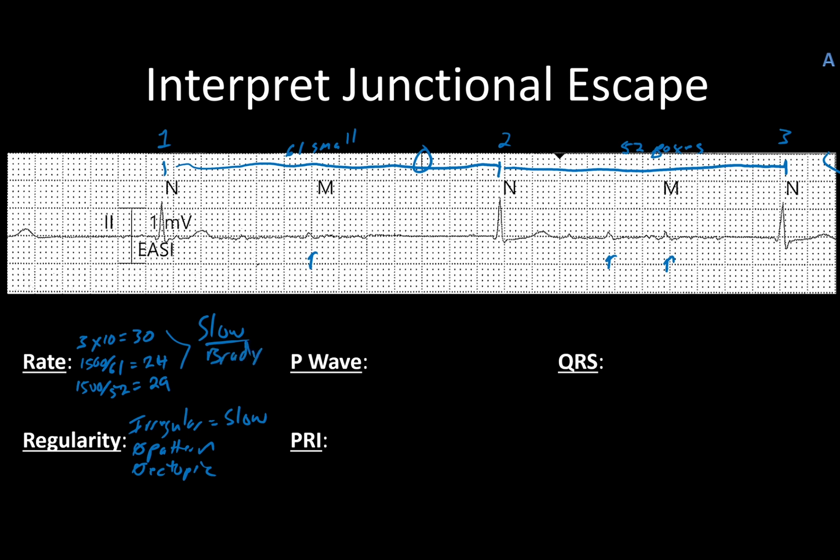Bradycardic. So let's take a look at our P waves, shall we? Hunting, there's nothing beforehand. All 3 of these beats are completely missing P waves in front of them. So no P wave. And that's where we'd normally expect to find them, correct?